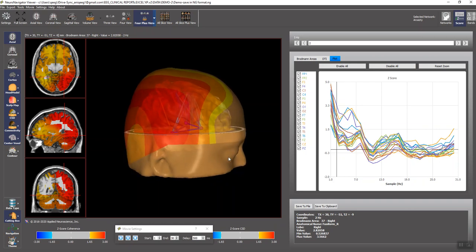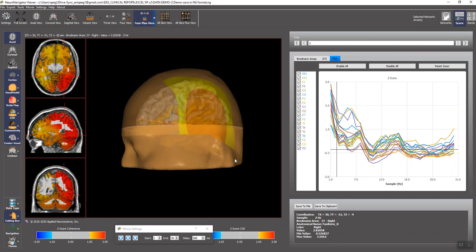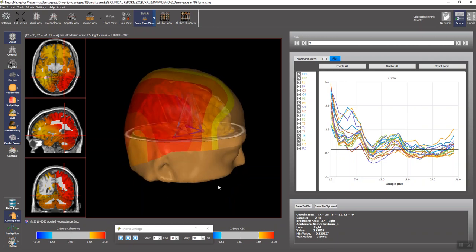This is a new addition to the NeuroNavigator, in which there's now an even more intimate link between the NeuroGuide assessment using different montages from linked ears, average reference, to Laplacian, to bipolars, etc., as you evaluate the EEG.